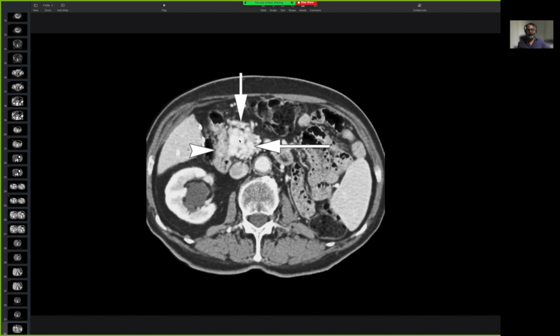The pancreas is a bit hard to see. It looks like mush on the CT scan, but I showed you how to follow it with the splenic vein, and as you follow the splenic vein, that's how you find the pancreas. So if you did have a CT in which you can scroll down, you would see this is associated with the splenic vein, and that's the pancreas. So that's a good, massive pancreatic mass right at the head.